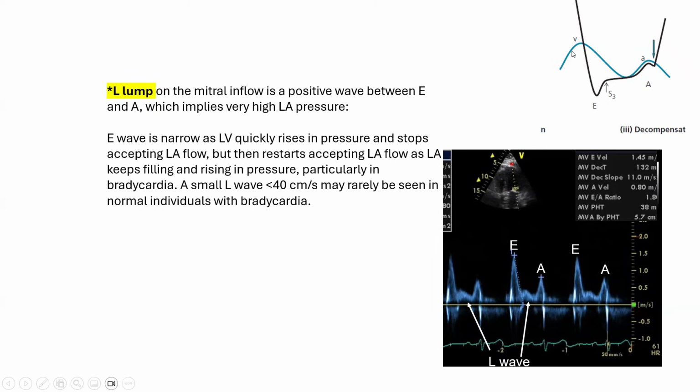So those patients have high LA pressure and high LV diastolic pressure. The LA empties into the LV briefly and gives that brief E wave, and the flow ceases initially. But that left atrium has a high pressure and its compliance is so overwhelmed, and it will continue to receive venous return in diastole that will make its pressure shoot up and will create further gradient during the diastasis phase. So you will get a bumpy diastasis. You'll get filling during what's supposed to be diastasis.